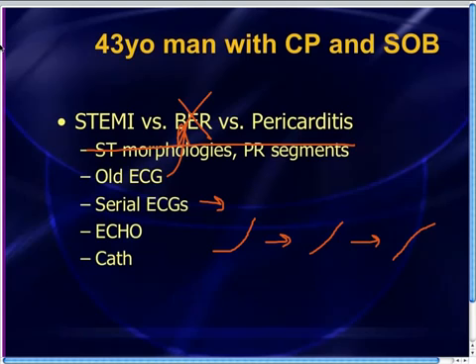Maybe those ST segments are starting to drop. Maybe you're starting to get some reciprocal ST changes. That also tells you that you're looking at a STEMI. All right? Maybe the T waves are getting, instead of normal T waves, maybe you're starting to get these hyperacute looking T waves. Or maybe they're starting to get very oblique at the beginning. We've talked about that in previous video casts before as well.